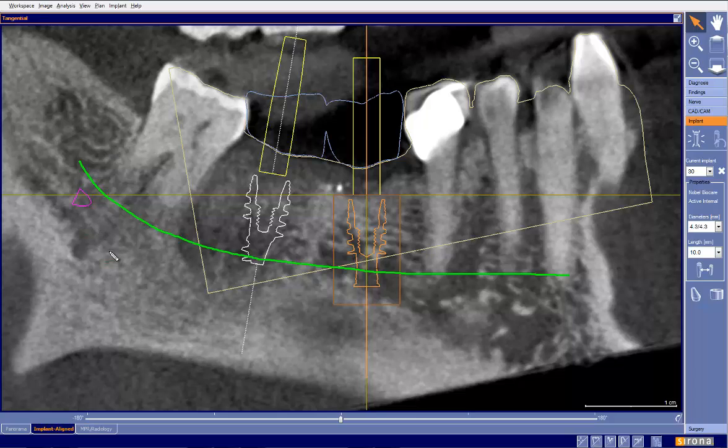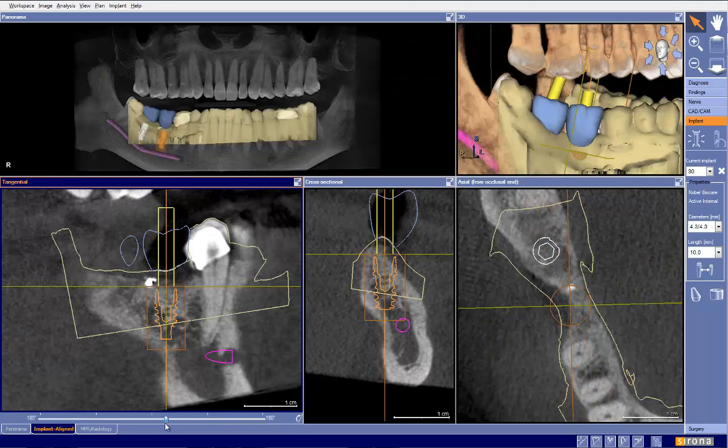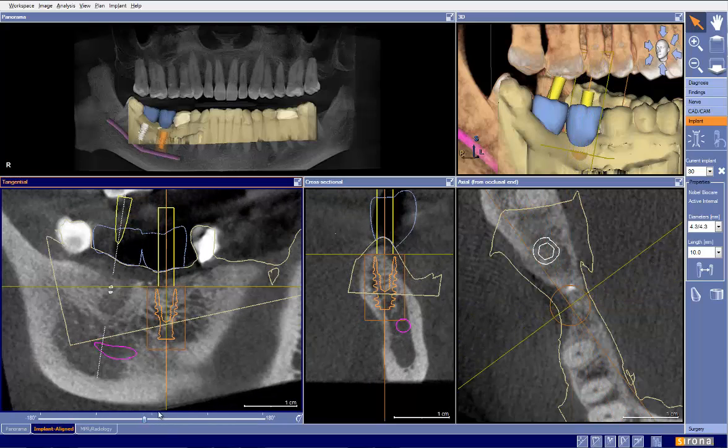Now, there are times where even using the adjacent teeth is not advisable, but very rarely will we find the nerve suddenly do things like this, especially if we took the tooth out and grafted it at that time. So I'm pretty comfortable and confident that the nerve typically will be in a relatively straight line. But again, the nerve is not something to be messed with. Hopefully that makes sense what I'm doing there. In this particular case, my guess is that the nerve canal is right here and not right here as it's been drawn. So we can go with that as our information.